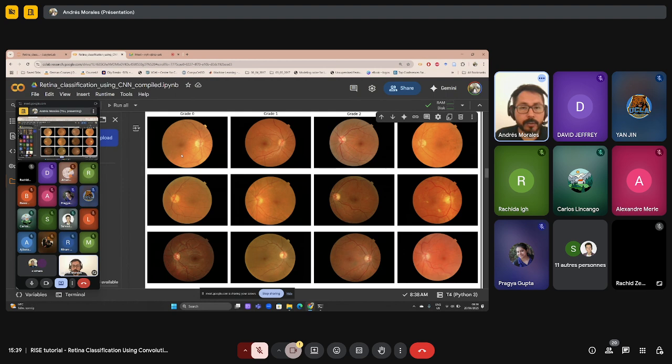So we have to somehow make the images square first so that they can enter the algorithm, but also better try to remove this black space on the sides, because it will not be useful for our classification algorithm. It doesn't give any information and could actually introduce noise to the model. So it's something that we have to check.